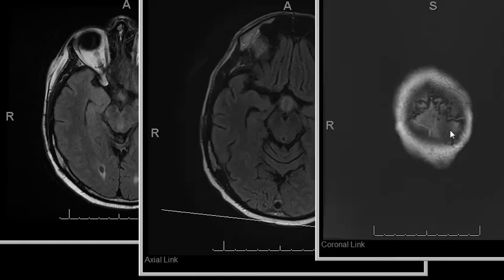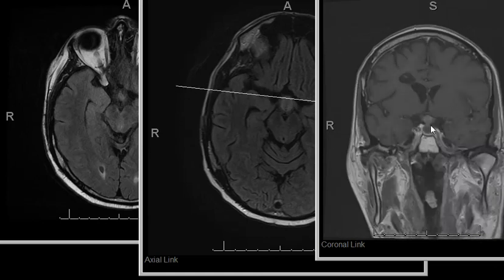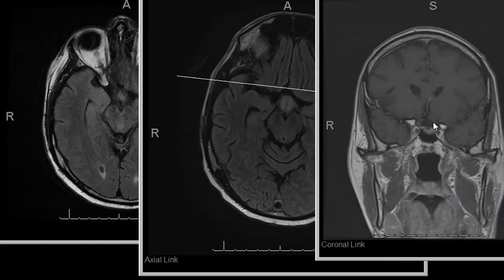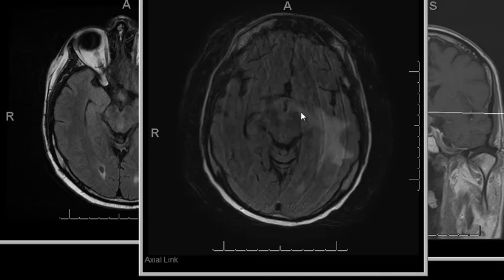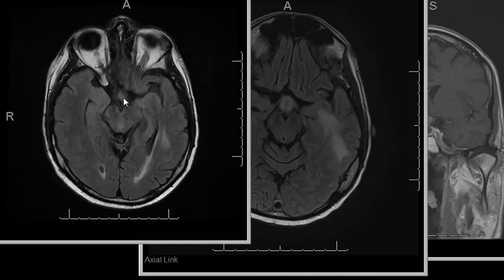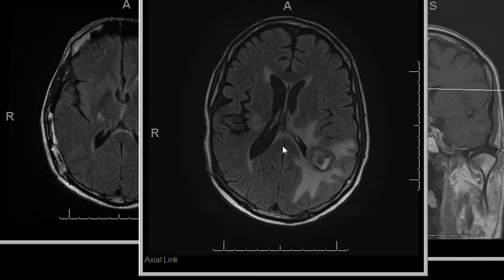This is the hypothalamus extending to the pituitary stalk. That is the reason I know, because the symptoms fit newly developed diabetes insipidus. Drinking so much, peeing all over himself, and they wanted to find out how to explain this diabetes insipidus. And this is the metastasis that wasn't there before. Other metastases are bigger, of course.